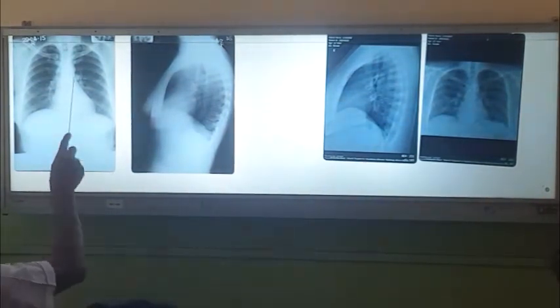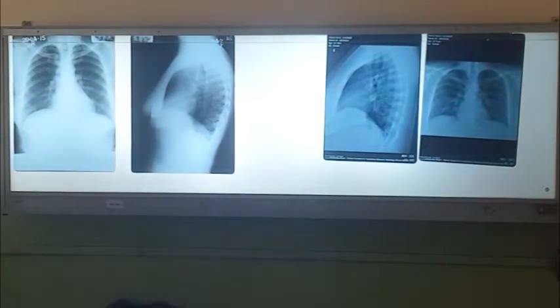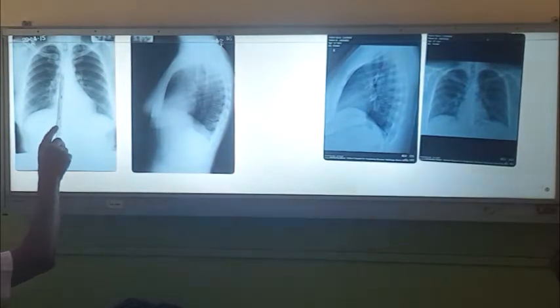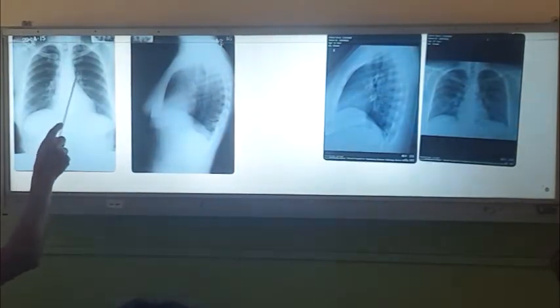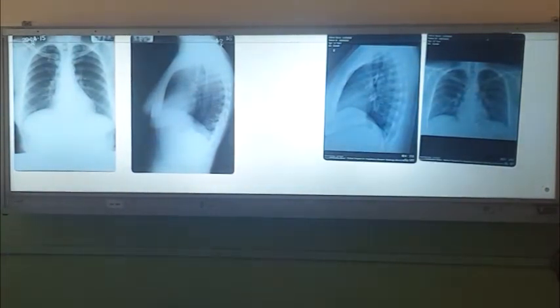And then this area is called the aortopulmonary window. In patients who have hoarseness of voice, always look at this point, because the left recurrent laryngeal nerve comes around this aortic arch, right? So lesions here will catch that. So you have to look for the aortopulmonary window, right? So that is about the normal appearance.